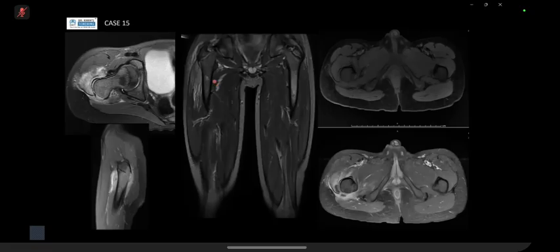Now, things to be aware of: in osteomyelitis in adults, your T1 is your friend, because focal areas of low T1 signal suggest a marrow process, which can be infection or malignancy, and it should be lower, so iso or hypointense to muscle, which suggests it's a marrow abnormality on T1. But in kids, we've got red marrow, which makes things a bit difficult. So T2 is your friend.